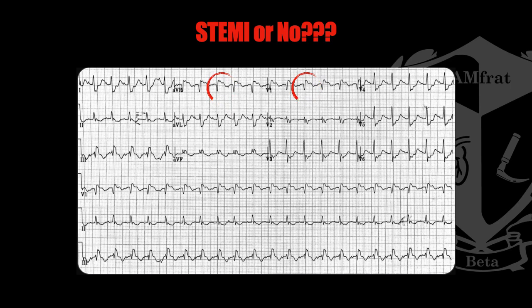It's always my recommendation that when you are approached with a 12 lead, you use a stepwise approach when you're trying to decipher what's going on. For me, I always use rate, rhythm, and then when we get to the axis, I use lead 1 and aVF. In this situation, it can be difficult with the shading and the thumb method, because if we notice in lead 1, there's a prominent R wave as well as a prominent negatively deflecting S wave.